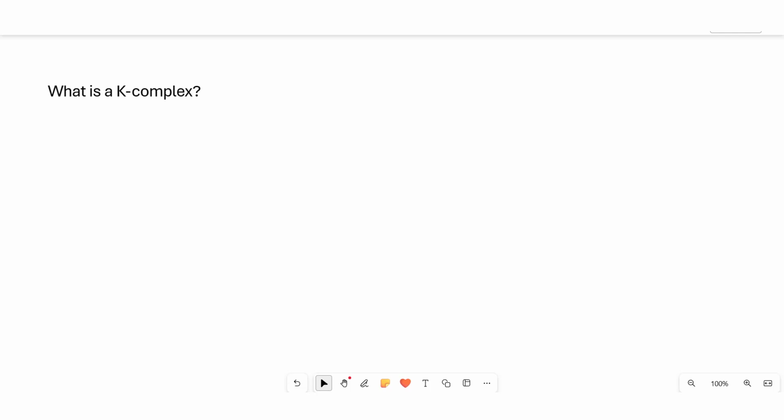This section of the course, my friends, please, is named K-complexes and slow waves. In this first video, entitled What is a K-complex, I'm going to first start talking about a specific type of wave that we see mostly in N2 sleep. And later, I'm going to talk about slow waves that are basically the same thing but appear continuously in N3 sleep.